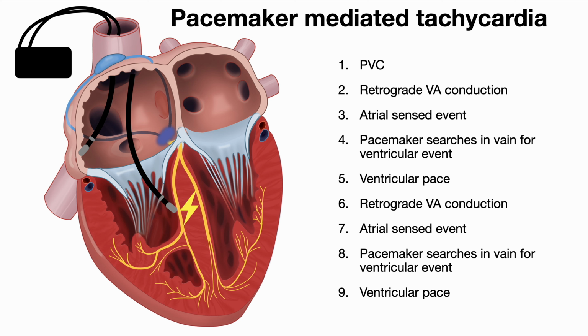And here is an animation showing what that looks like sped up a little bit, the whole cycle.